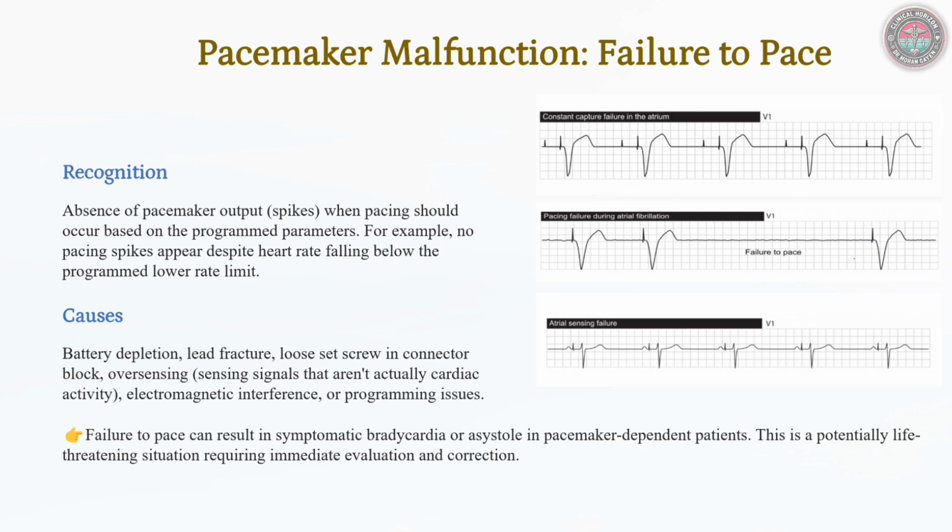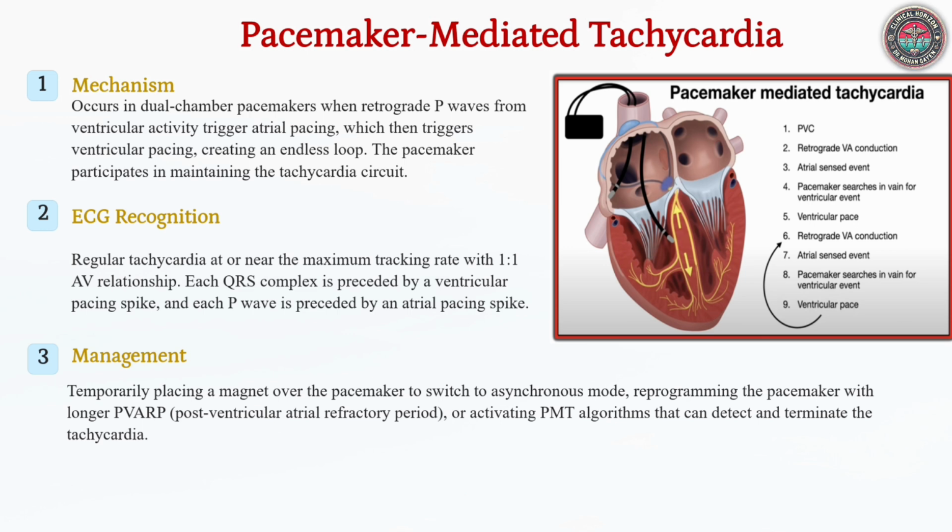Pacemaker-mediated tachycardia, or PMT. PMT is a reentrant arrhythmia involving retrograde P waves triggering atrial pacing, which subsequently triggers ventricular pacing, creating a continuous loop. On ECG, PMT appears as a regular, rapid rhythm, with consistent pacing spikes before each P wave and QRS complex.